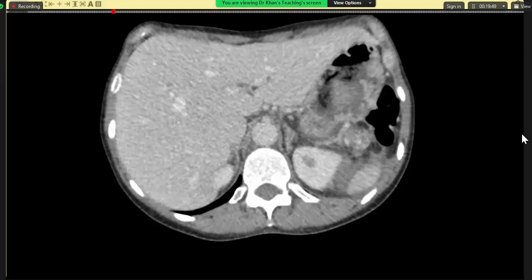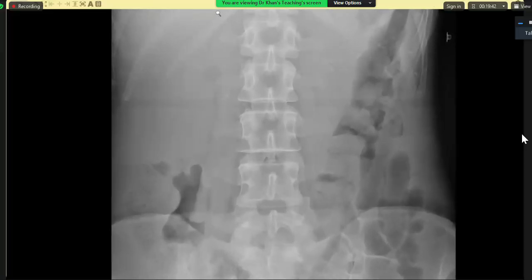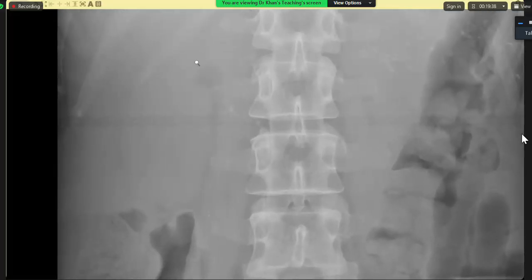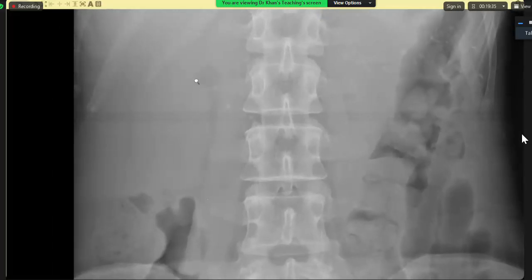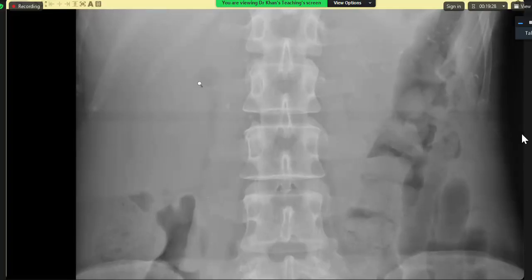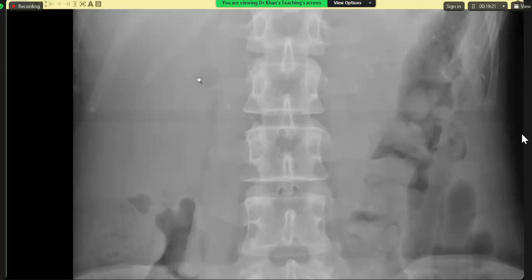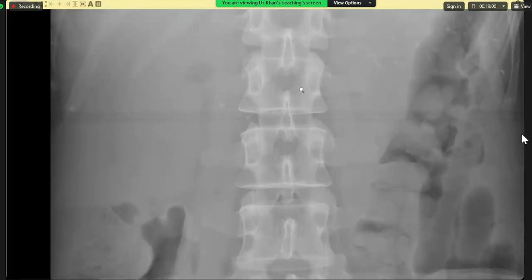Okay, this is a case of acute over chronic pancreatitis. So once you have picked up calcification, which was well picked up, nobody is stopping you to ask for this. So this is a feedback for the second candidate: ask for a magnified view. Say that in my clinical practice, and this is what you should do, because in your description you said unlikely to be renal, but the point is that it cannot be renal. The point is it is going over the spine, and you can be absolutely confident once it crosses the spine, so ask for this.